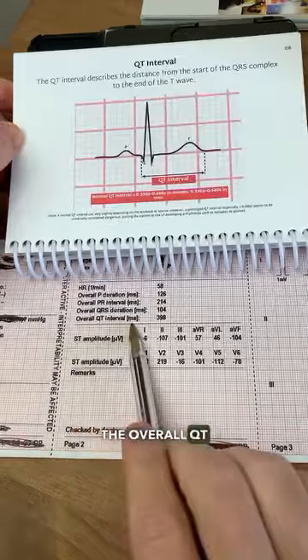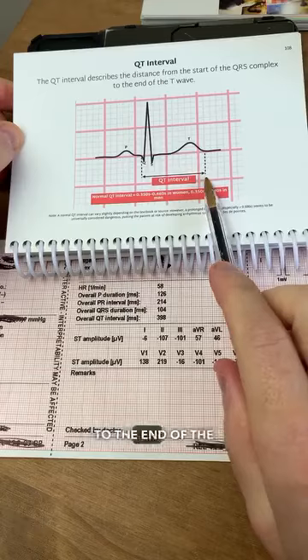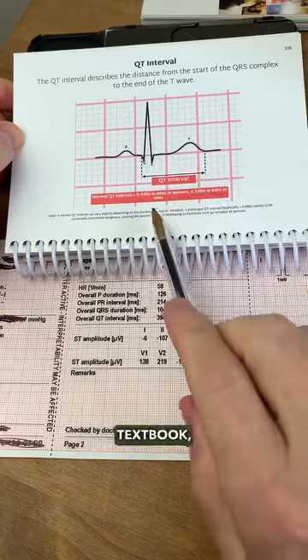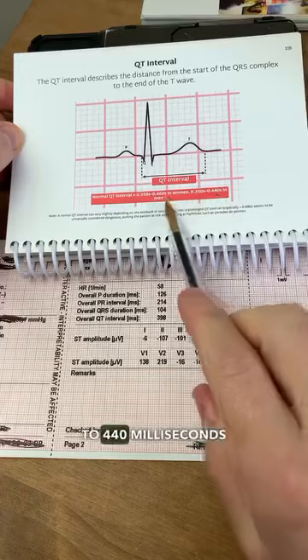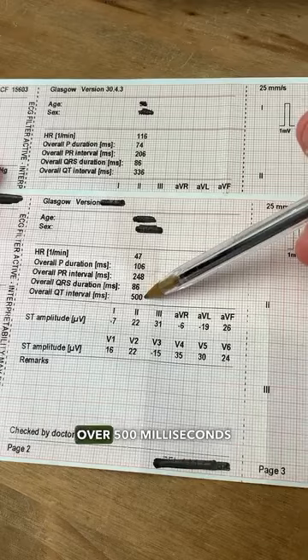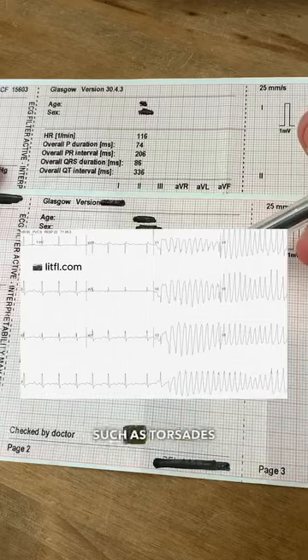The overall QT interval describes the distance from the start of the QRS complex to the end of the T wave. Again, normal durations vary slightly depending on textbook, but anything between 350 to 460 milliseconds in women and 350 to 440 milliseconds in men is generally considered normal, with a duration over 500 milliseconds seen as extremely prolonged and at a high risk of developing life-threatening arrhythmias such as torsades de pointes.